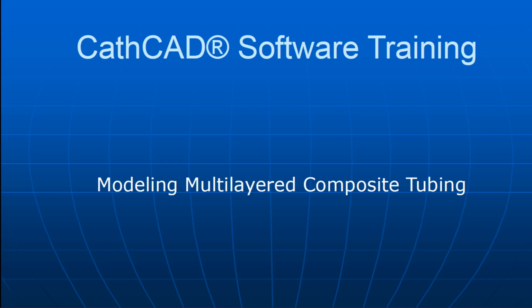Welcome to our CathCAD software training series of videos. This video will detail the concept of modeling multi-layered composite tubing using the CathCAD software.